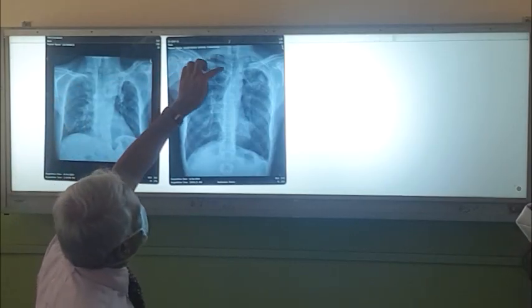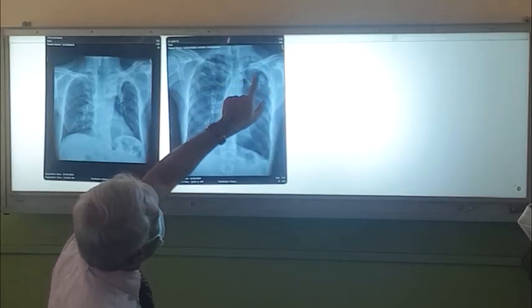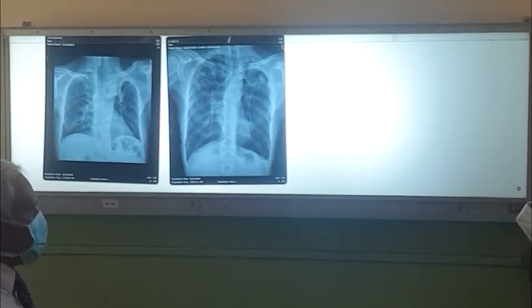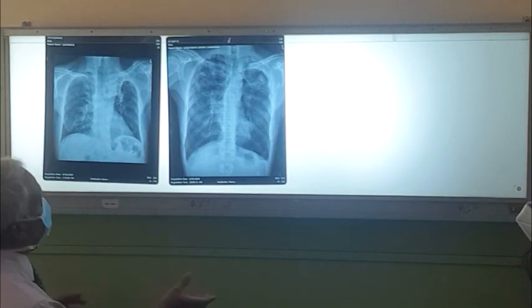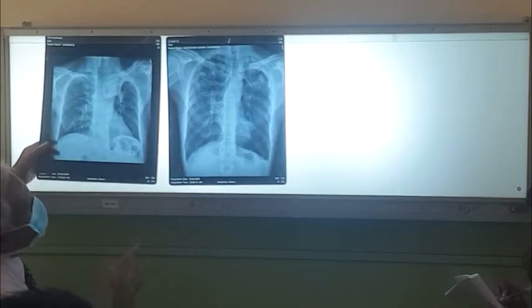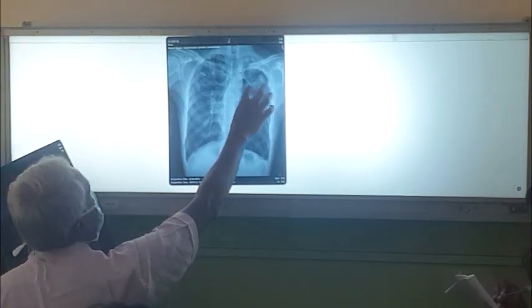So these are all cavities, and there's a pleural thickening here, and there's a cavity with an intracavitary body. So you have to think of mycetoma. So patients with TB, when they cure, later on they can come with hemoptysis, and you have to do an X-ray and see whether they have mycetoma in addition to reactivation, right? Mycetoma and malignant formations.